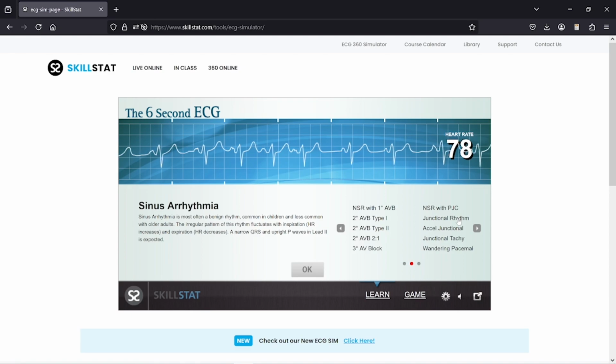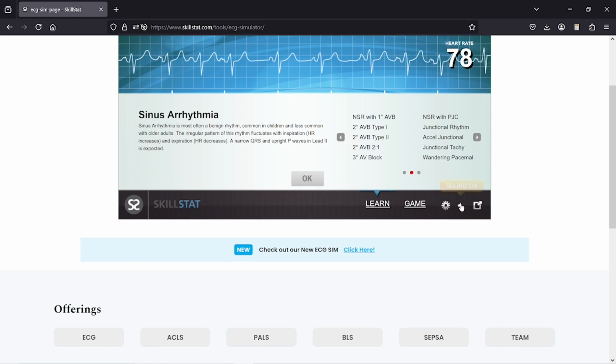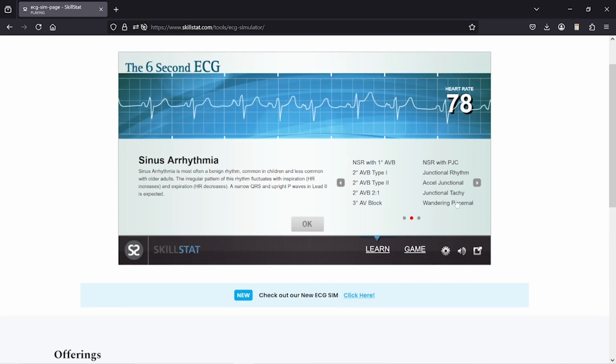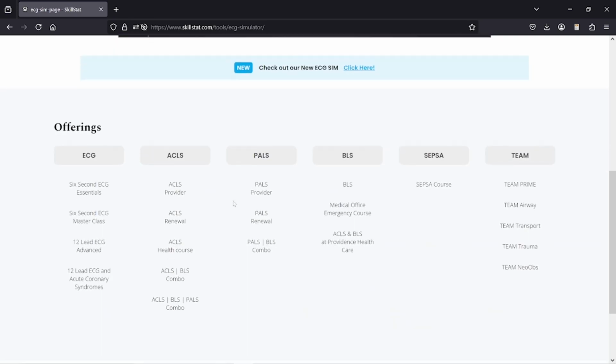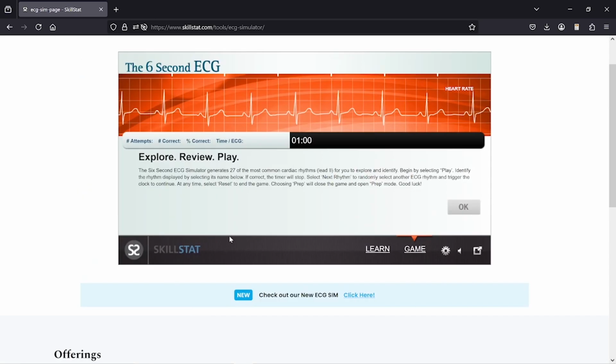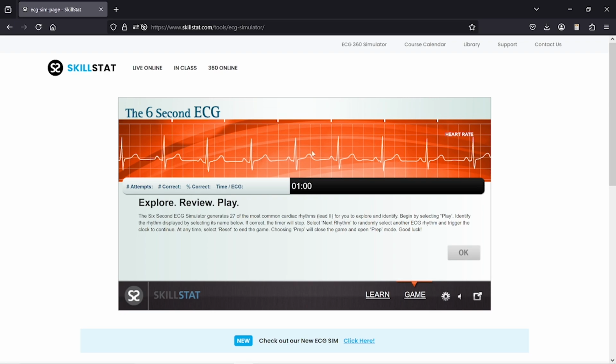But again, huge shout out to Skillstat.com. It's amazing that they offer this service for free. We love you so much. This is such a kind thing to give to the medical community. You can also mute it. It's very loud if you don't mute it. And it goes for each beat, right? And then the guy, whenever you get it right, he yells, right. But overall, it's just such an amazing tool to have. And I always recommend it for paramedic students or just people who are interested in EMS.